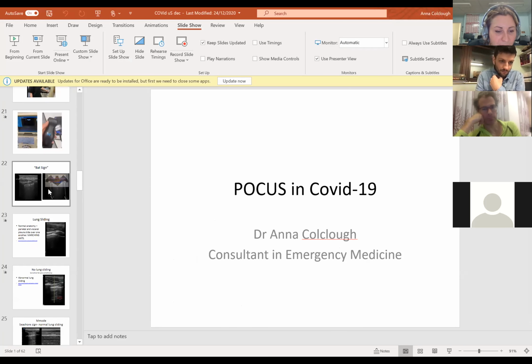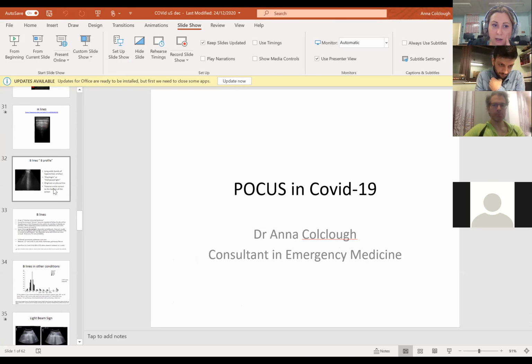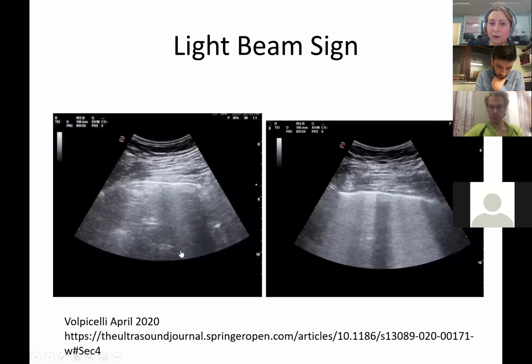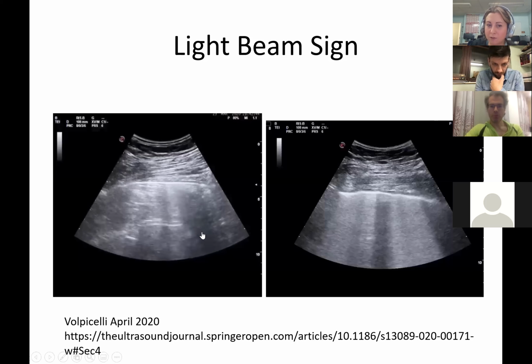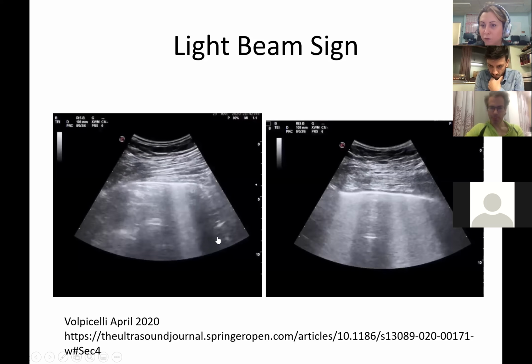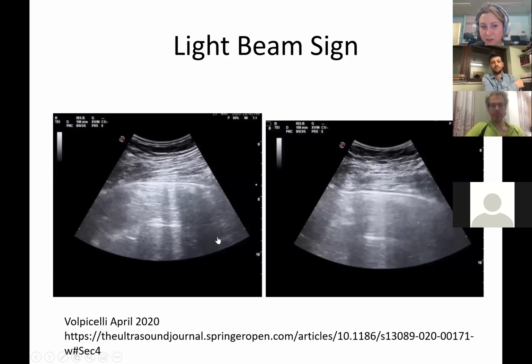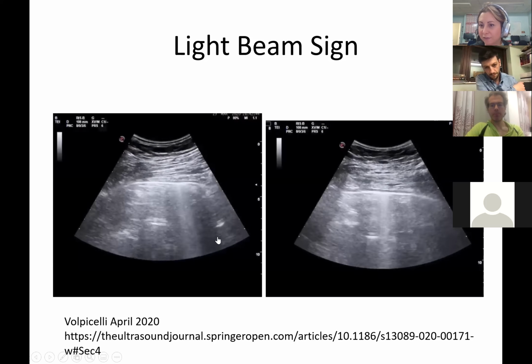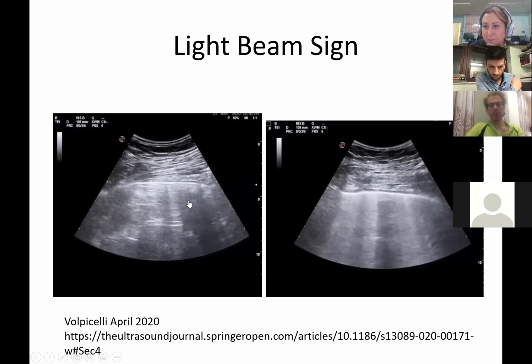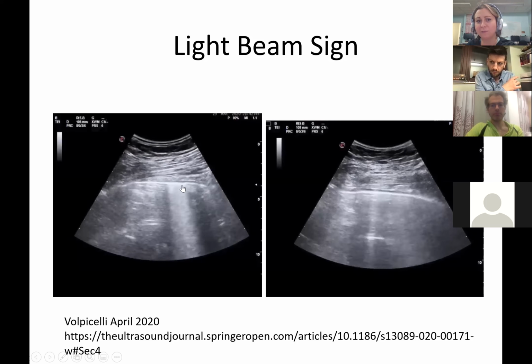What he means is a sort of band of confluent B lines coming off a little stretch of pleura, which might be at that stage just before it's got inflamed and had that roughening. So this is the early stages of ground glass opacification forming on CT scan. So before the pleura becomes rough and interrupted and has those really obvious viral pneumonia changes, we've just got B lines to work with. But often this is just as they come to hospital, sort of day 5, day 6. So they can be a bit tricky. Hopefully there's something that suggests infection in the history, but if not, this appearance, so this is a little band, you can see there's a few centimeters of pleura that's affected.